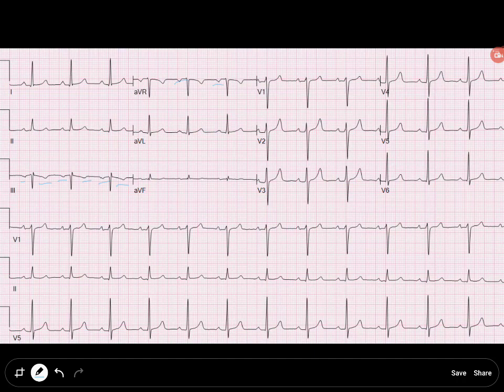Looking at the anterior leads, those look good. Lateral, V5, V6, 1 and AVL, those look good as well. And looking for ectopy, such as PACs or PVCs, we find that there are none of those. I did want to mention something that's called R-wave transition.